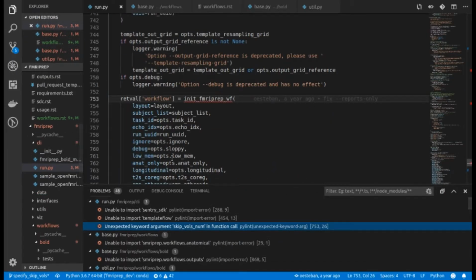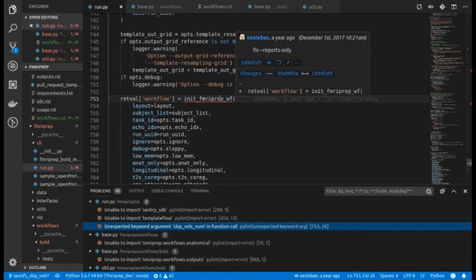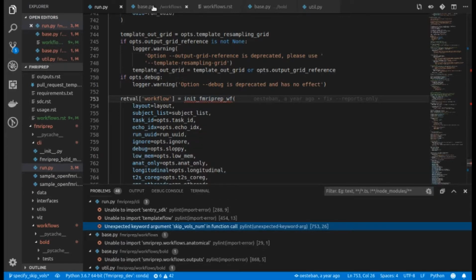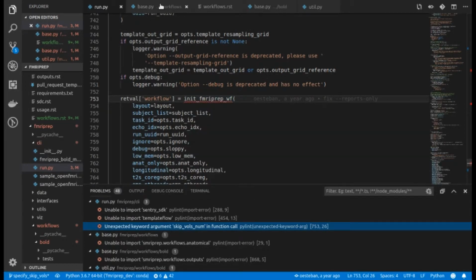This is still just bugging me. I'm sure it's some super simple, obvious thing too, that either me or someone else looking at this video is just like, oh my gosh, it's so simple. Why is this unexpected? I defined it, I put it in the definition.